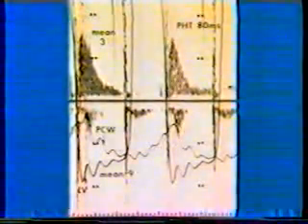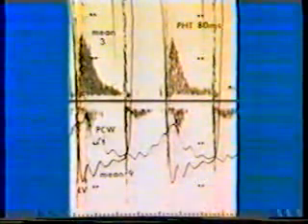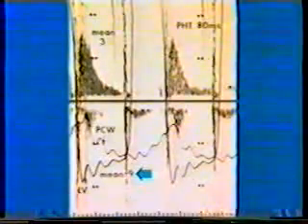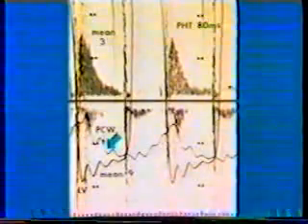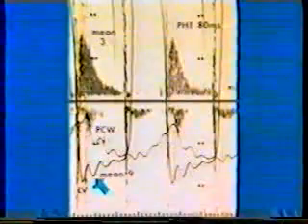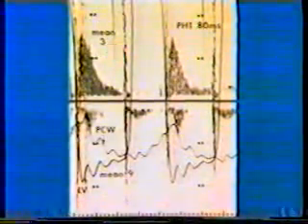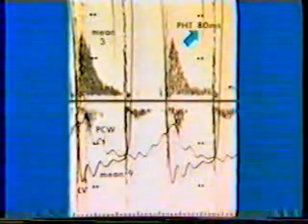The overestimation of mitral prosthetic gradients by catheterization using pulmonary capillary wedge pressure is illustrated by this case. This patient was identified as having a 9 millimeter mean gradient across a 29 millimeter Bjork-Shiley mitral prosthesis, using the difference between pulmonary capillary wedge pressure and left ventricular pressure. However, the mean gradient was only 3 millimeters of mercury by simultaneous Doppler evaluation. Note that the Doppler pressure half-time was also normal, 80 milliseconds.